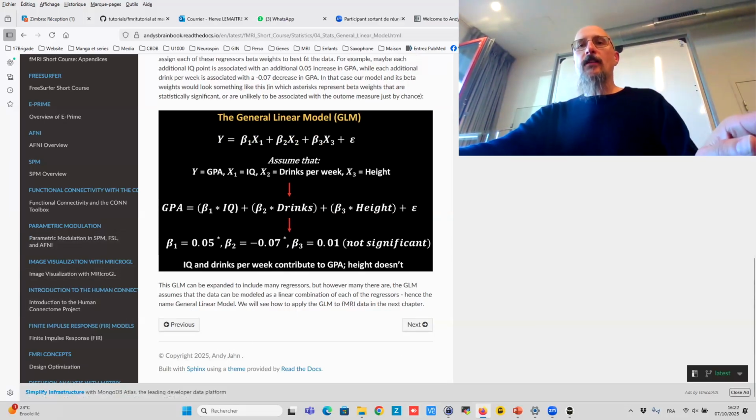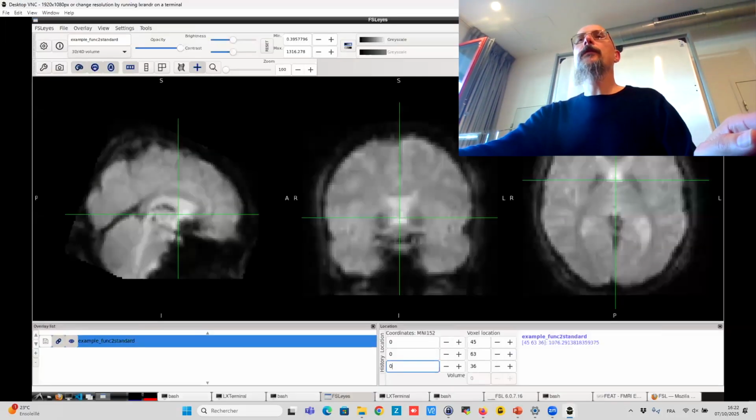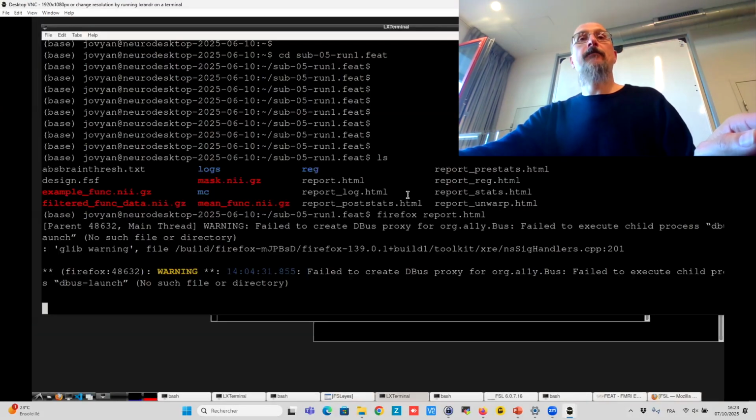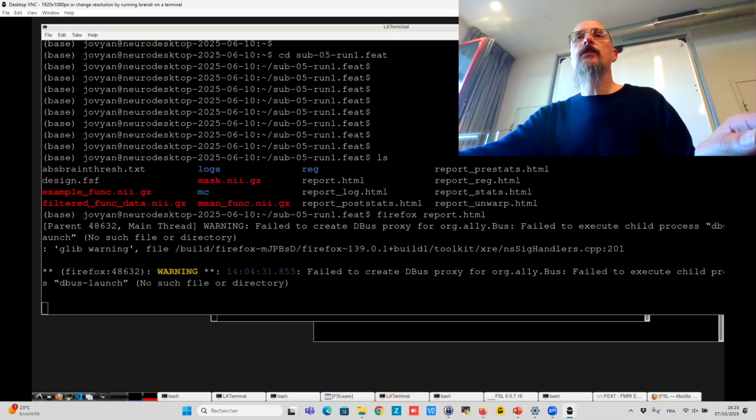Okay, so if you go back to the folder where your data is, let's go back here. Yes, you can close the report session. You don't need it anymore.